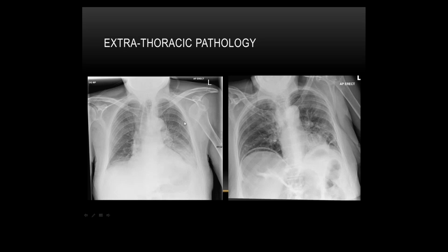This was a patient who fell in ED, one I was talking about earlier on. The patient fell in ED, and they came with a pneumothorax. I think the patient had dementia, so we weren't able to assess it properly, and then they came back as that. So this shoulder view shows an acute dislocation.